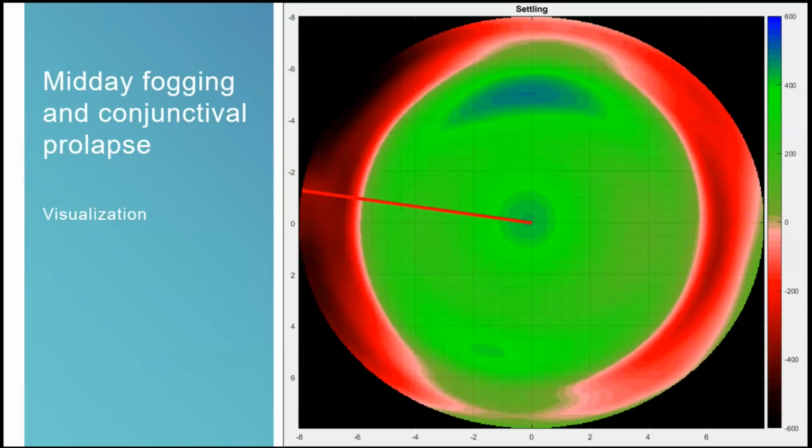If you would fit, let's call it a classic scleral design, so that means you're fitting a lens having a spheric optical zone, a spheric transition zone, so a spheric limbal zone, and only toricity in the haptics, so in the landing zones.